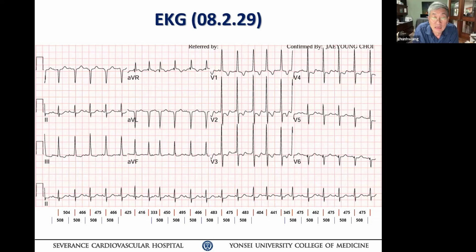So you could guess it is a sinus tachycardia or ectopic tachycardia, but ectopic tachycardia in children also goes very fast, it doesn't go this slow. Unless, as I said, the patient took medication, and they're treating her with pills. Maybe that's a different story. But based on this ECG, the only thing I would say is the patient probably has sinus tachycardia. Now, if a patient has right ventricular hypertrophy, you would anticipate a bigger P wave. So I think that's what we can say.